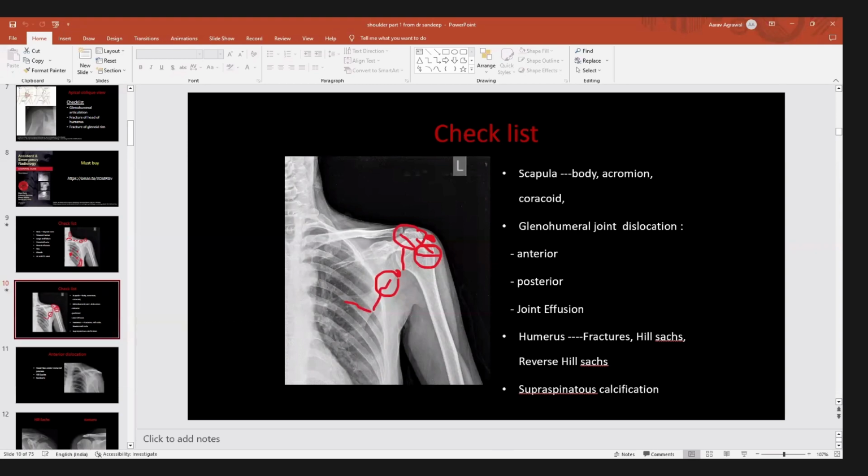So like previously, I'll put on this spotter and everyone is expected to write their response in the chat box. Yes. So this is spotter number 1.